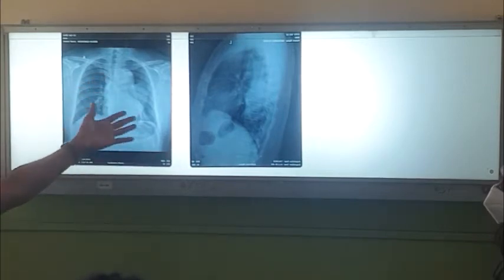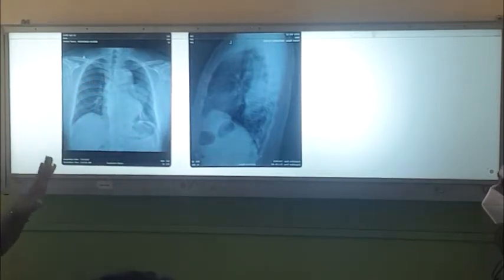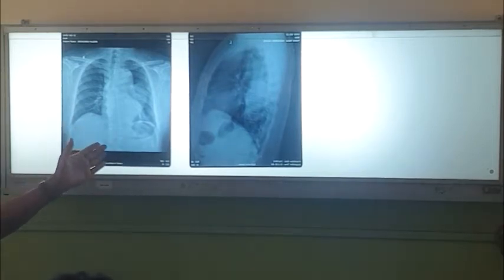And you take the history, this patient has come with interscapular pain, severe interscapular pain. So that is enough for you to suspect dissecting aortic aneurysm. So this is a patient with dissecting aorta. If you take the history, a few words, that is enough. Then you look for the dissecting aneurysm here.